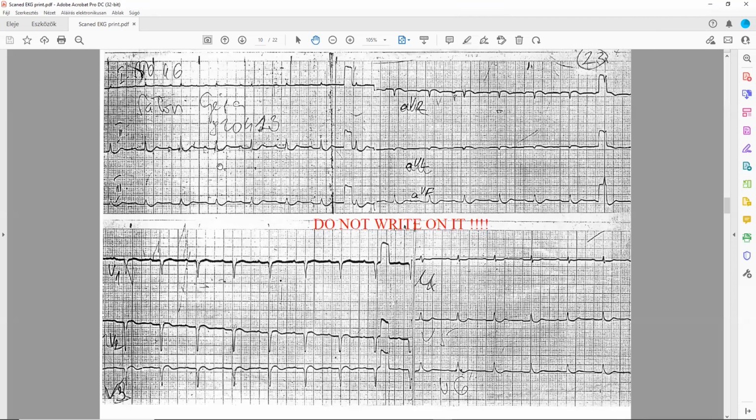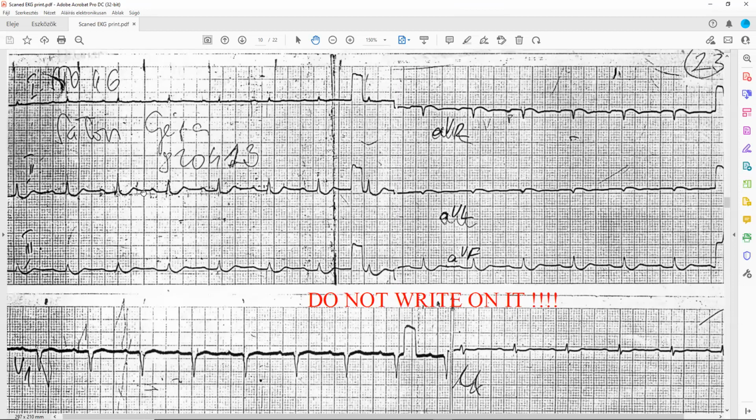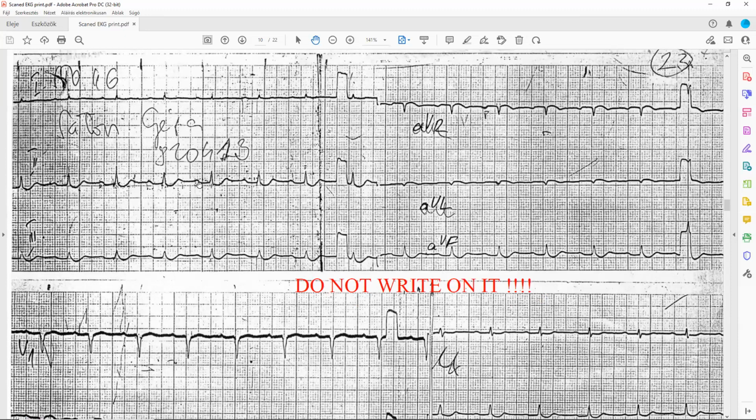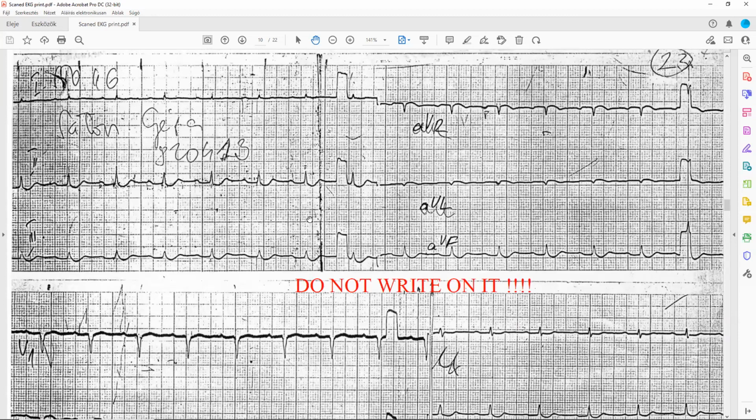Go on. And then do we have P waves? Yes, in lead 2 we can see P waves, and they are appearing before each QRS. So it's normal. And then the PR interval, I would say it's also the same, but a bit wide, longer. What does it indicate? A long PR.